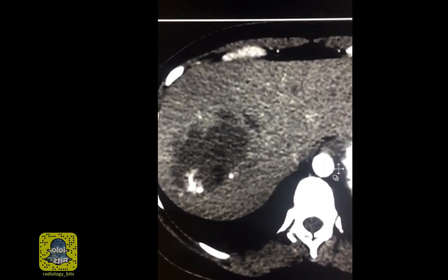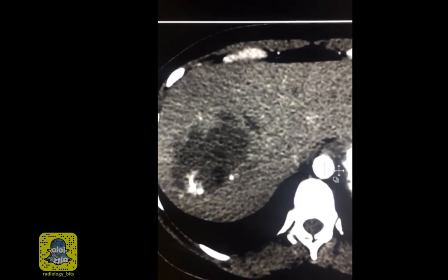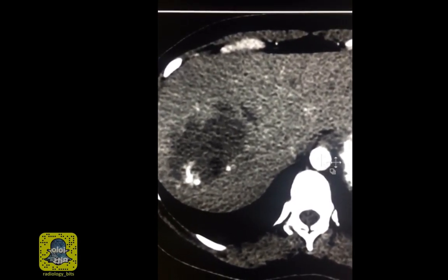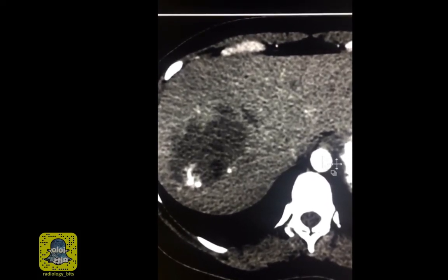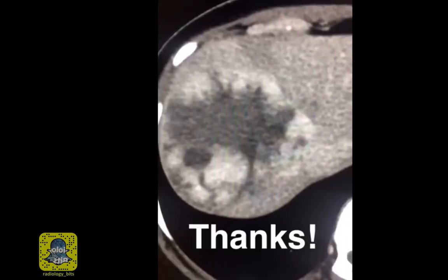That's it for typical hemangiomas. However, atypical hemangiomas become more interesting. Hopefully in the near future I'll show more atypical hemangiomas, for which a discussion would be more interesting for seniors.